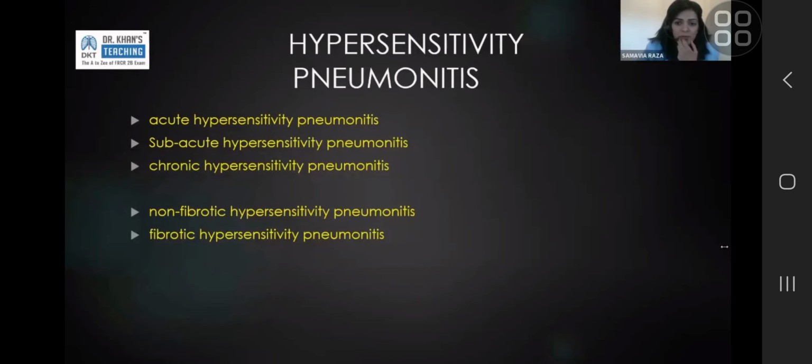Mosaic perfusion, how to know which is abnormal. If the black is too black or the white is too white, I'm guessing the question. The answer is experience. White, or ground glass, is easier to appreciate. Sometimes the hypoattenuating or the darker part of the lung can be more subtle, and it comes with experience. Obviously, when the dark, hypoattenuating part of the lung is air trapping, you can see it be more prominent if you do an expiratory scan. But that's a question for experience.